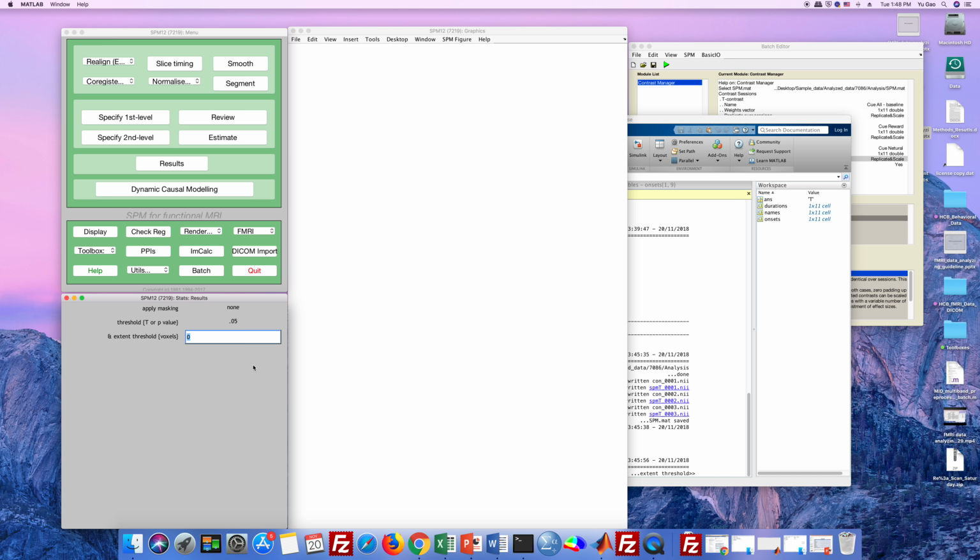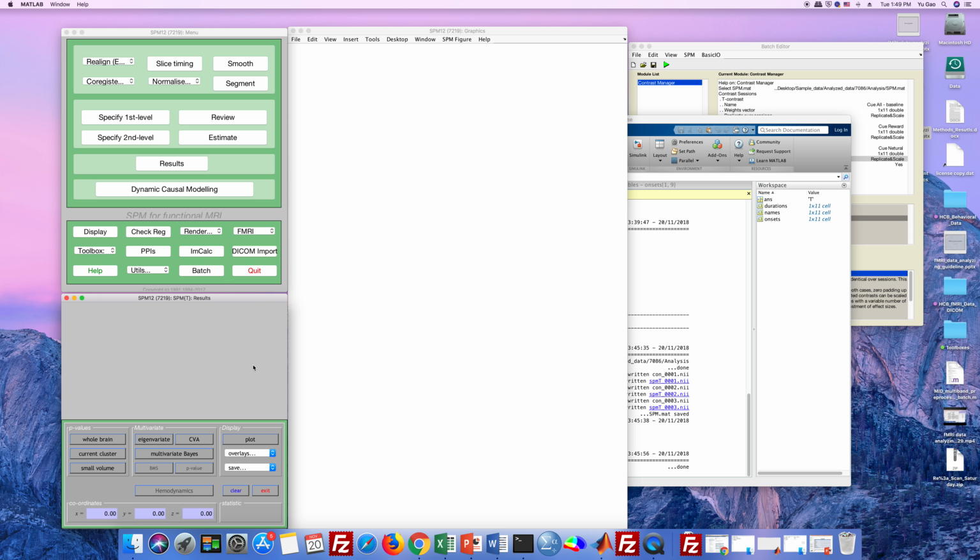So the extent voxel count means how many activated voxels are grouped together in the physical space for us to treat it as a real activation. If you have strong activation, a cluster of voxels should be activated together around an area in the brain. Here, because we want to define a more liberal activation threshold, we just choose 0.